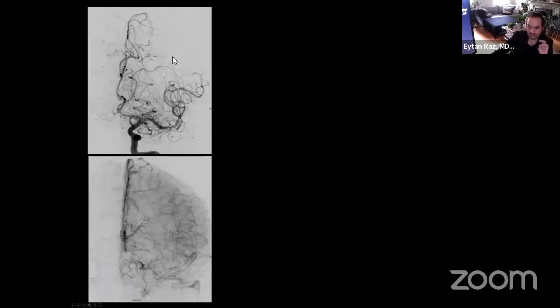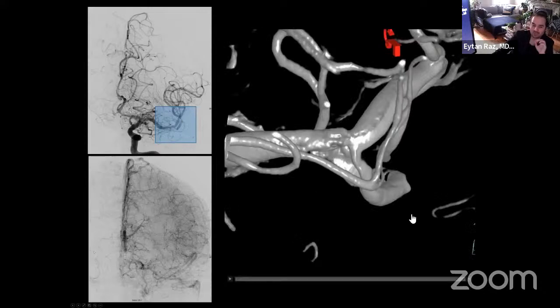examples. Okay, so this is a patient with certainly some hypoperfusion of the left MCA territory. Comes for angiography, and you see there's certainly some stenosis here that you may not really understand very well unless you do the proper imaging. And once you get the proper imaging, which in this case is a cone beam CT, you magnify this particular region and now you understand this better. This is the M1, this is the M2, and this is the other M2. There's certainly a stenosis here.